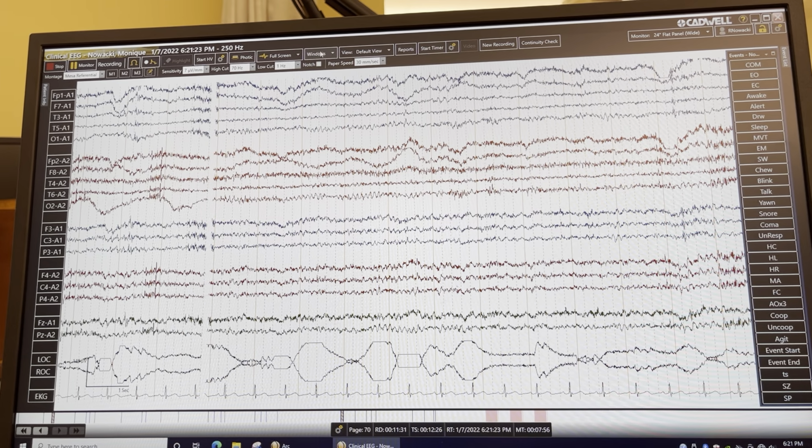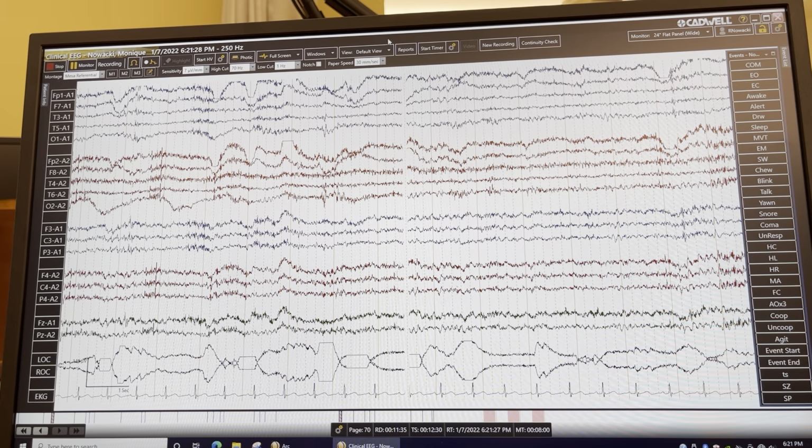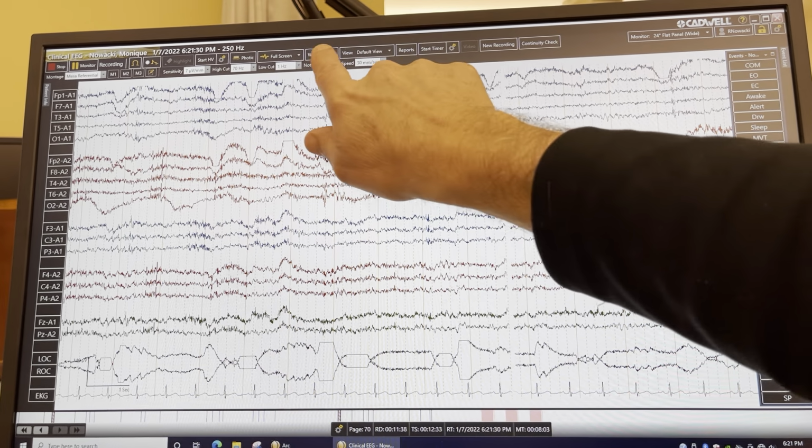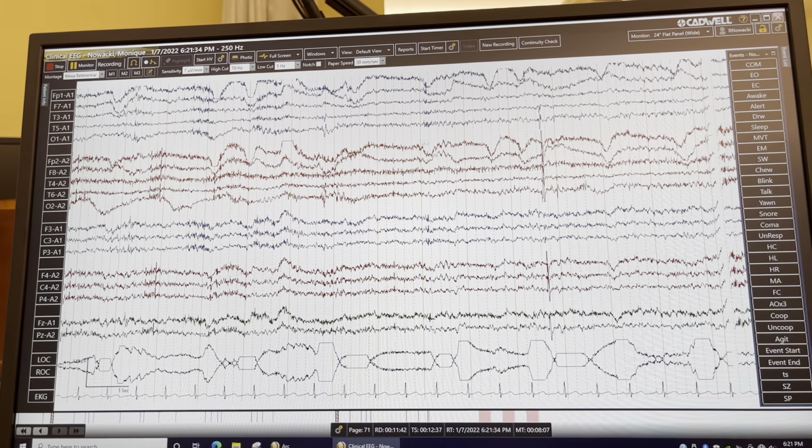Okay, we're going to skip Windows right now. I don't know if we use that. And we're going to skip these two. I don't think you're going to be using that all that much, and the reports too.